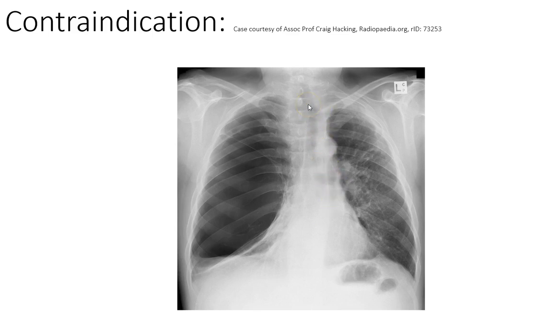So the trachea, straight and central, it perhaps is a bit deviated off to the left, and now I'm looking for those lung markings, and I can quite clearly see the lung markings are not normal. We can see this all the way to here, and there's lung markings all the way to here. This is probably the horizontal fissure, it might be, or actually, that's not the right place for the horizontal fissure, it should be in here. So there's something strange going on in this film. I wonder if some of you know what it is.